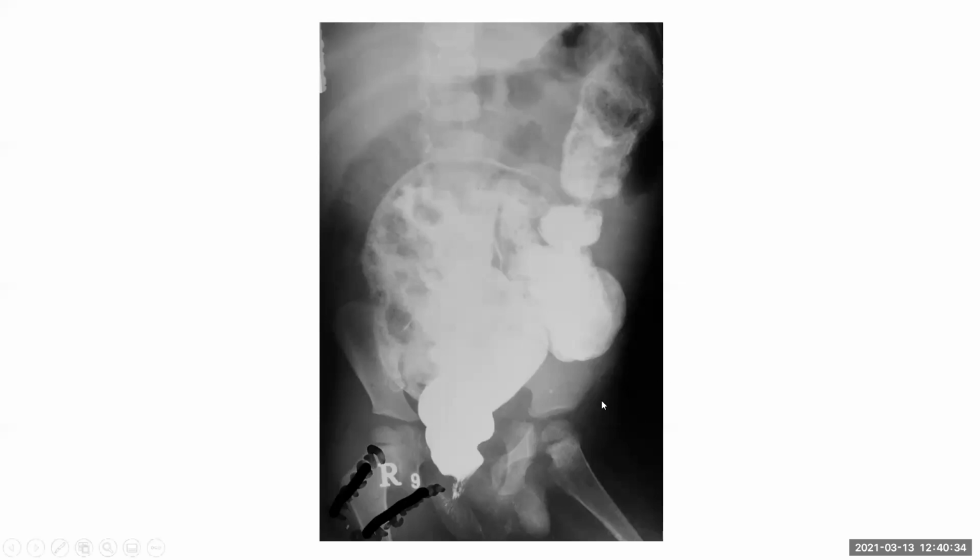And one thing I want to tell you: the abnormal segment in this case is always the narrow segment. This is just a contraction. The dilated part is the normal bowel. The aganglionic segment is the narrow part. This goes into spasm, and to overcome this, the gut keeps increasing its movement and gets dilated.